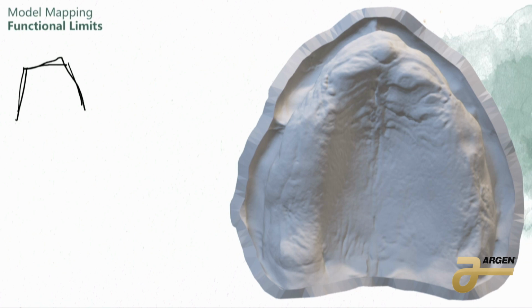So the recommendation for a square arch is 6 millimeters-ish, around that 6 millimeter mark from the incisive papilla. So we find our incisive papilla here. We mark the center. 6 millimeters ahead of that is typically a general good starting point. Is that perfect? No, but we have no other information to go off of, so we're going to go from there.